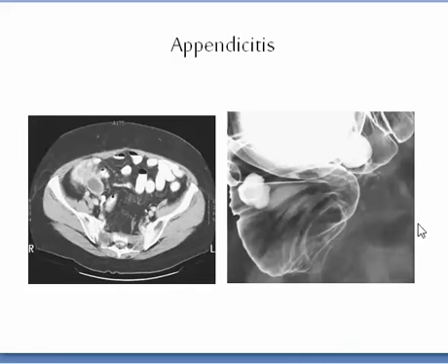In appendicitis, you might find this indentation due to edema of the appendix and swelling, or you would find such a thing with appendicular inflammatory changes. A tubular structure at this right iliac fossa could be an appendicitis, but if lower down, it should be correlated with the region of the tubes in females, and diverticulitis in both males and females.